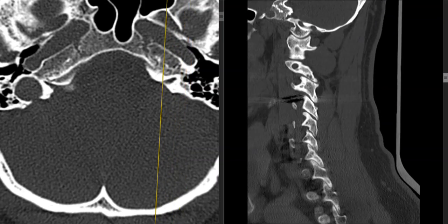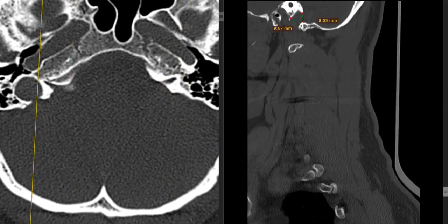So you got 7-7. When you come over this side, you got a lot more millimeters happening here on the right side, and you can see where we're looking at. A few more millimeters usually would tell you that there's more pressure inside of that jugular vein, and it tends to erode inside.